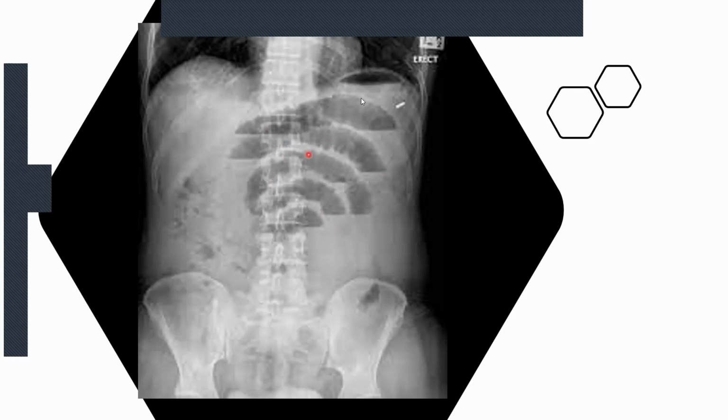Sometimes it can be a late sign, and generally the more feculent the vomit is, the lower down the obstruction is. Now, this one looks more like a mid-bowel. And once you get to large bowel, of course, then vomiting can be a very late sign. And instead of seeing the conniventes here, you see haustra, which are very different, and I'll hopefully look at that sometime in another X-ray.